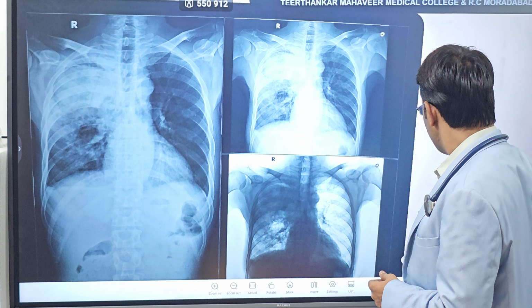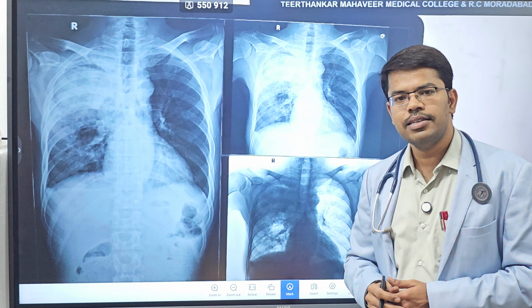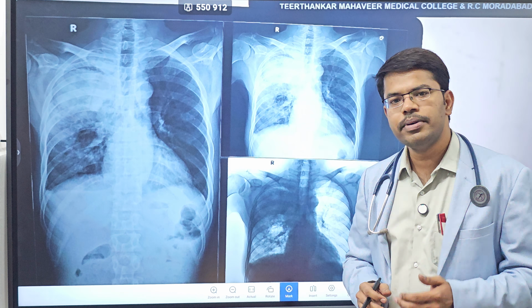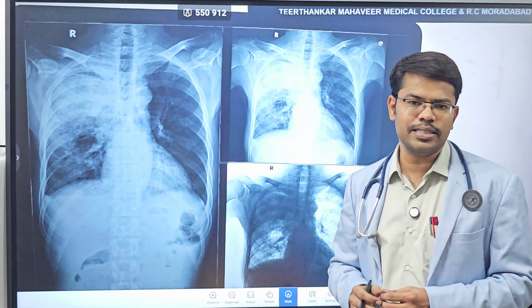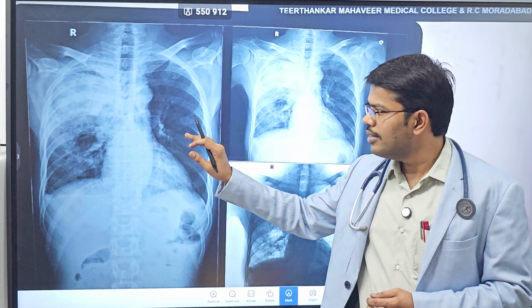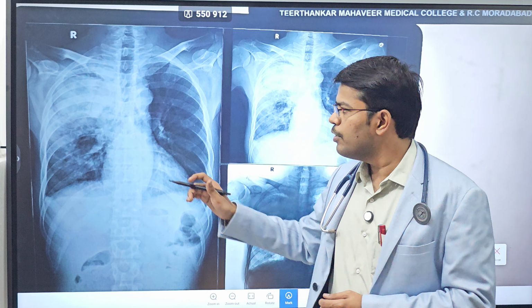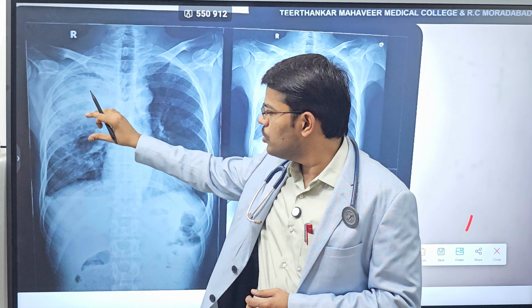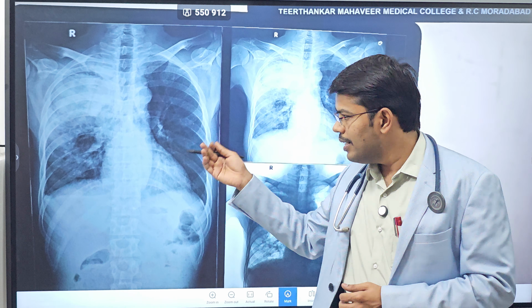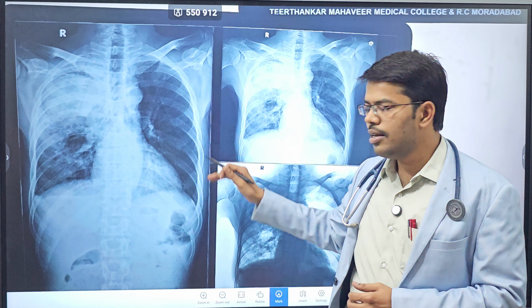So what are the follow-up questions which are common after this? Especially in the final DM exam, these kinds of X-rays are more typical whenever the patient is immunocompromised. In an immunocompetent person, you are unlikely to get right upper lobe or upper zone pneumonias. In the X-ray, you will say upper zone, mid zone and lower zone as per the X-ray numbering, whereas clinically, you will say upper lobe, middle and lower lobe.